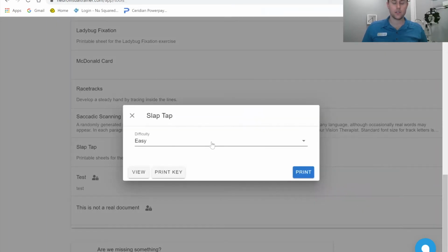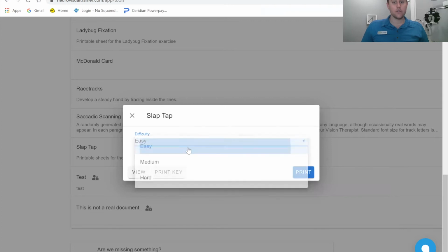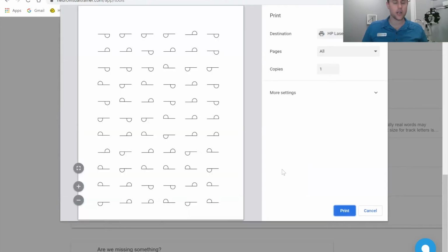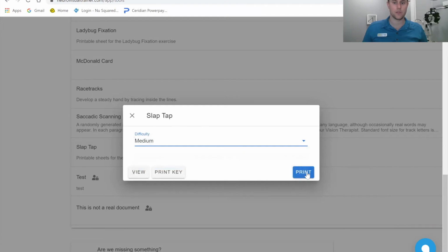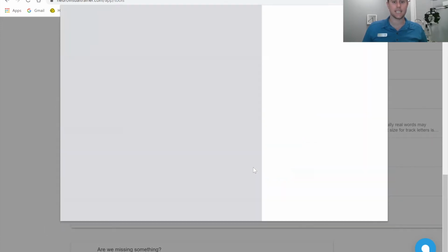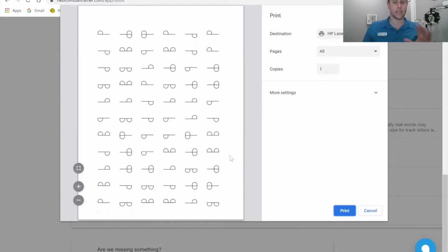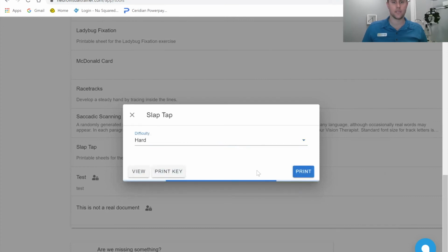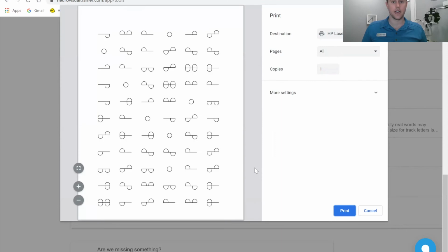And then the actual charts themselves, again, you'll see different levels here. And if we take a look, you can print them right from the software, and it randomly generates different charts each time. So you can see level 1 is primarily just going to be one body part at a time. As you move to medium, what we like about this is you can get into some layers where you've got 2 body parts, and hard, you can see you're going to get more body parts involved.